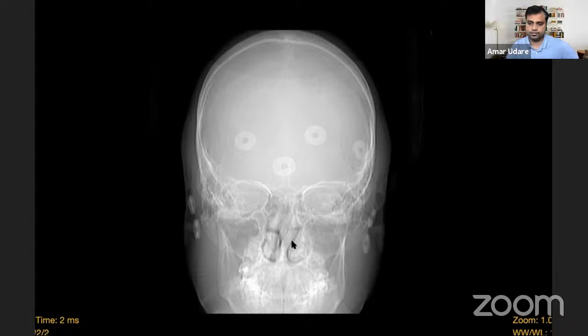What's happening here? Beveled edges, yeah, that's very typical for eosinophilic granuloma. I'll explain what beveled edges means when we follow up with our discussion. So it has been rightly pointed out that in a pediatric patient, if you see multiple aggressive skeletal lesions, neuroblastoma mets should be on top of your differentials.